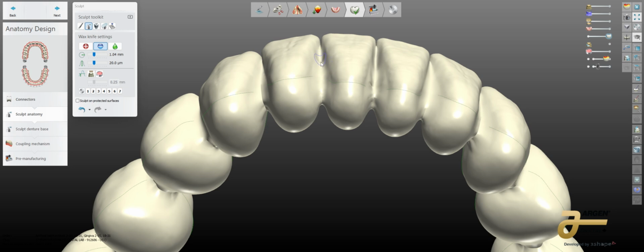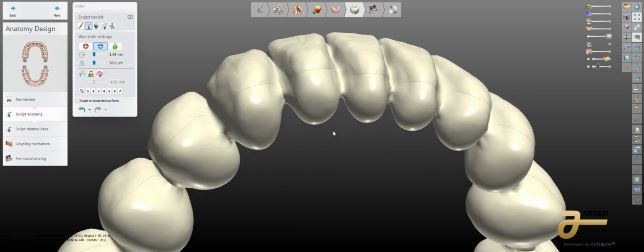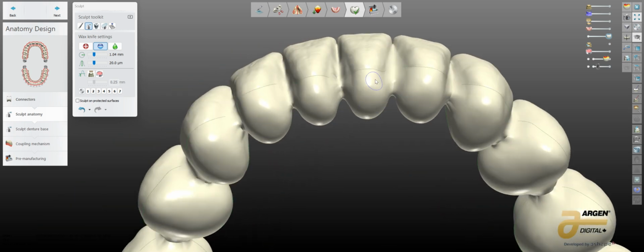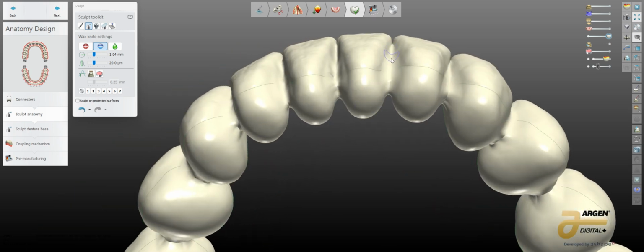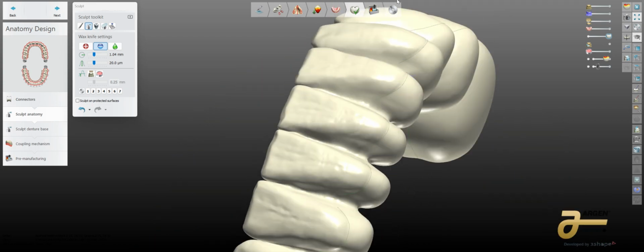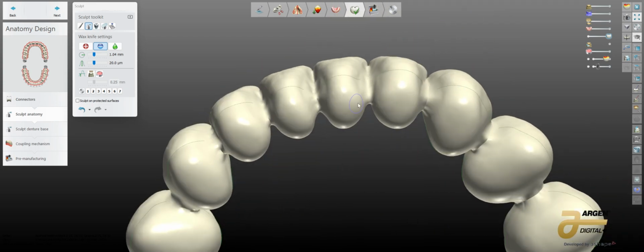So I tried to pull it in one uniform pull straight back. Doesn't always work perfectly. You can always use that back button. But again, if you can smooth this like I'm doing it, very uniformly, you can even use the tweezers to be able to pull down in that center section as well. I'd like them to make a tool that was ovoid that I could just pull straight down in the center section here to morph this.